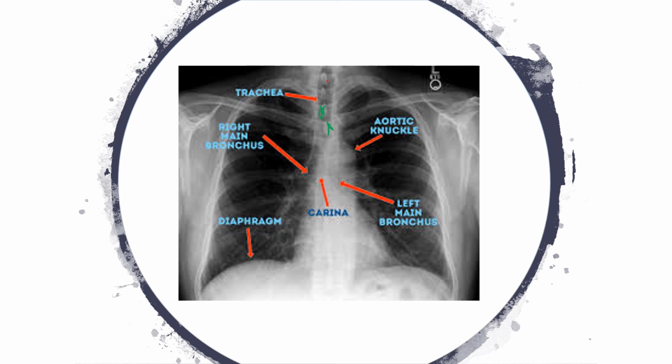Is this image reliable? Can we see the spine through the heart silhouette? You can see the separations of the vertebral columns here. That's a good sign. That means the film's not over-penetrated or under-penetrated. So that means it's not more opaque than it needs to be, or more radiolucent, darker than it needs to be. In other words, it's the right density to get the right diagnostic value out of this. Those are some of the things that we'll be looking at here.